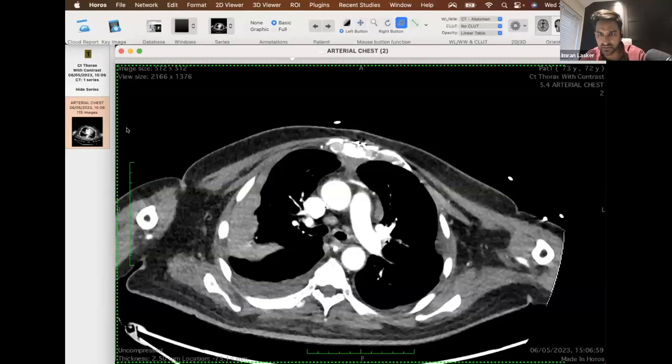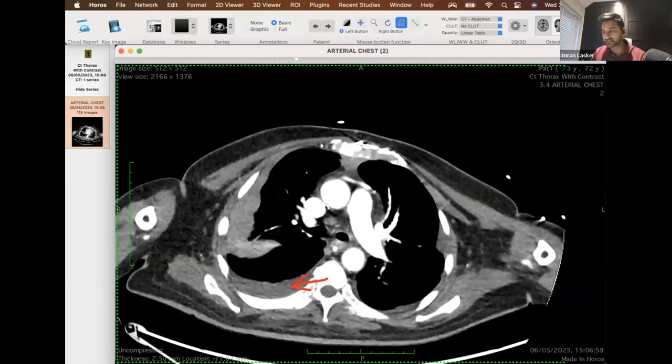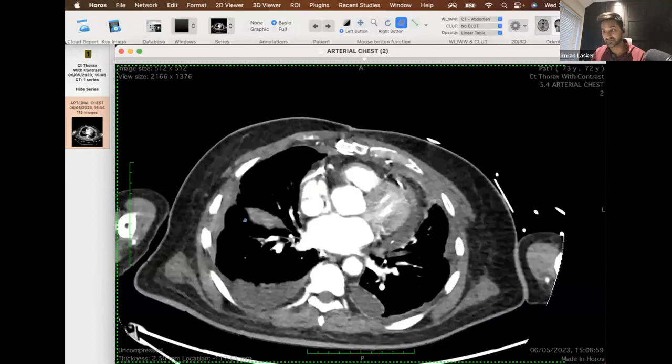So now when we go back to the CT scan, a few people have said right side pleural thickening with associated moderate pleural effusion. So people have said that there's pleural thickening, which is not a bad shout. I assume you're talking about, well, I guess it's going to be this area over here, yeah? Some of you may notice that there is a bit of a difference between the density of this area compared to this density over here. This looks slightly lower density and this looks slightly higher density. And actually it looks like it's tracking along the oblique fissure and all the way down. And there's a very definite difference between the densities of the fluid that is located within that hemithorax.